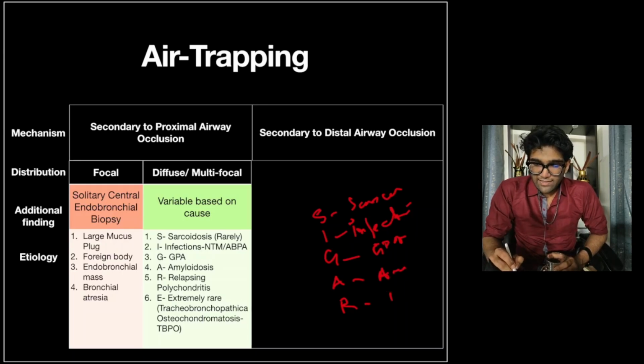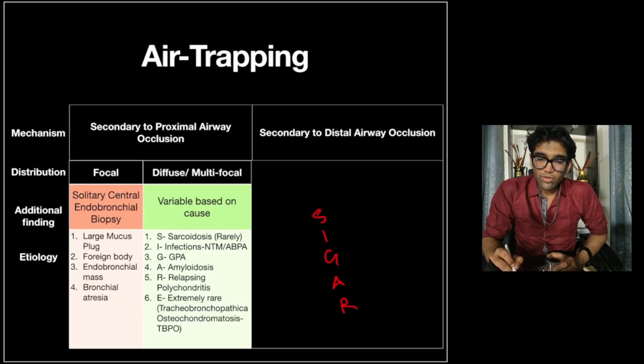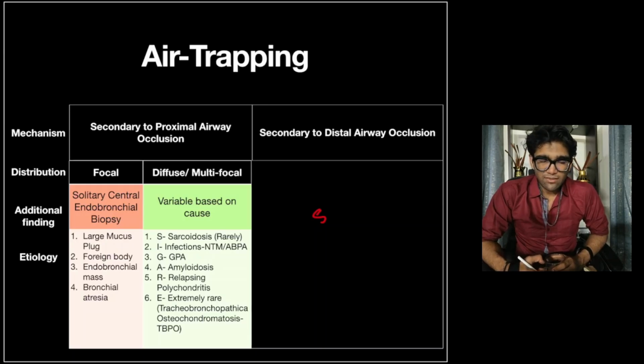So I've modified it slightly for the sake of endobronchiolar or bronchial mass lesions, in that IgG4 typically doesn't affect the internal diameter of the airways. So here it is an infection, usually infections that produce mucus plugs.